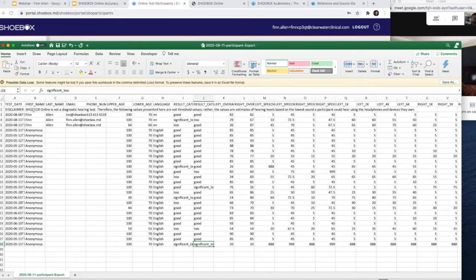So we do a lot of work in the background to try and get screening accuracy as close as we can. We want to give you all the details we can, but as you know, we're not in a booth. We're not doing a modified Hughson-Westlake approach, so they're not threshold. So let me take you through some of these details.